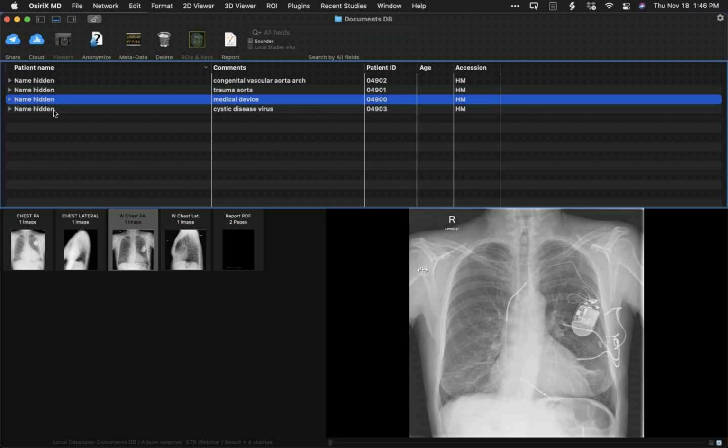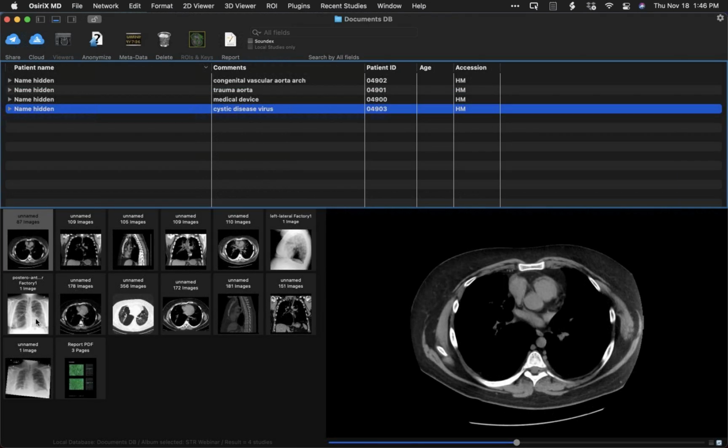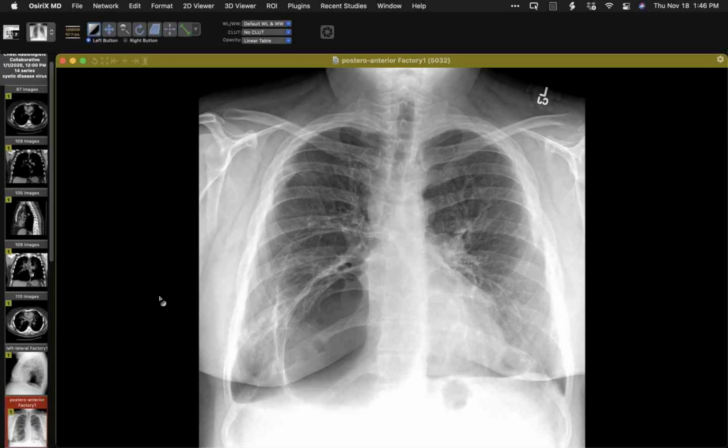This one is a very interesting case. It was kind of also a bit perplexing. So I'll just show you the radiograph of this young person. I forget the person's age, but I think he's now in his 20s. And I came across this in the context of surgery here, in preparation for and subsequent removal of the right lower lobe. So we have a lot of abnormality, obviously big cysts here. And if you look at the vessels in the lungs elsewhere, some of them appear to be small.